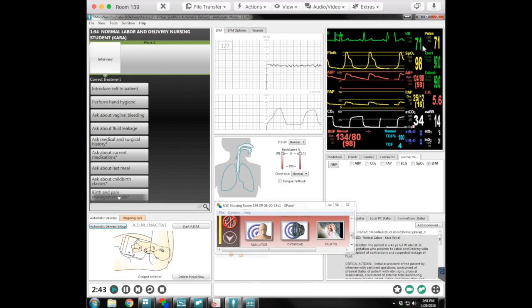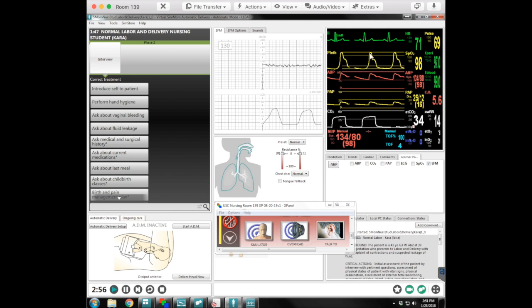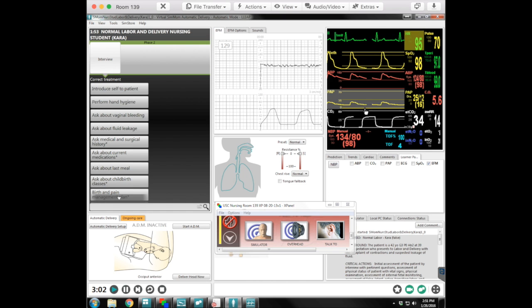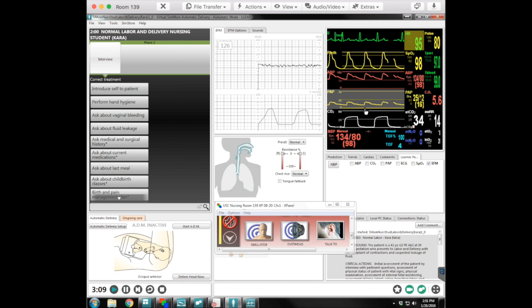This works just like SimMom. Any of these you can change on the fly or be programmed for whatever it is. But if you're just curious to see how this works, you can just click on the number and change the number, much like the intro to SimMom using Lleap software in that video that I showed you earlier.